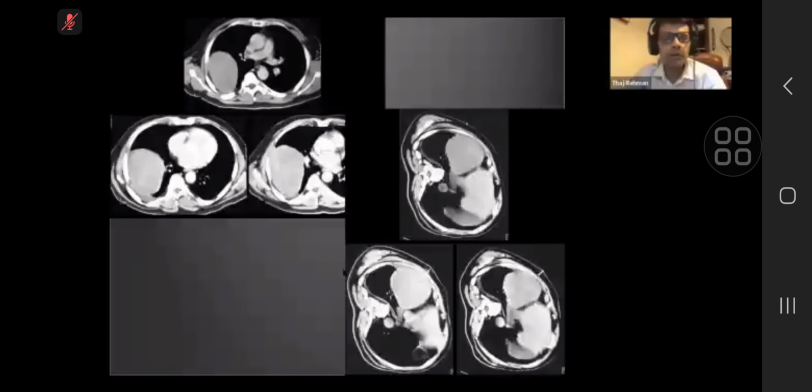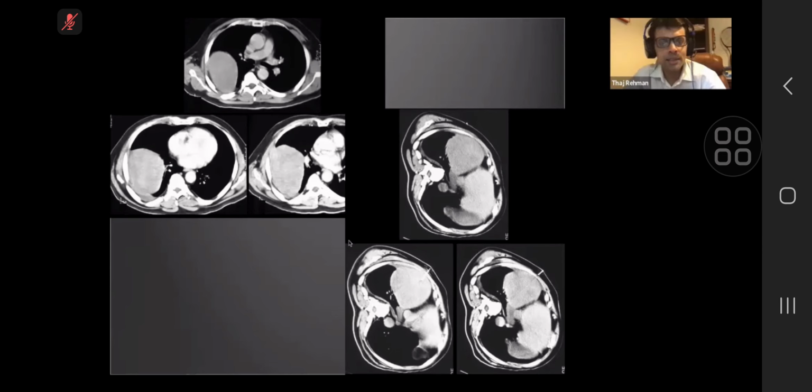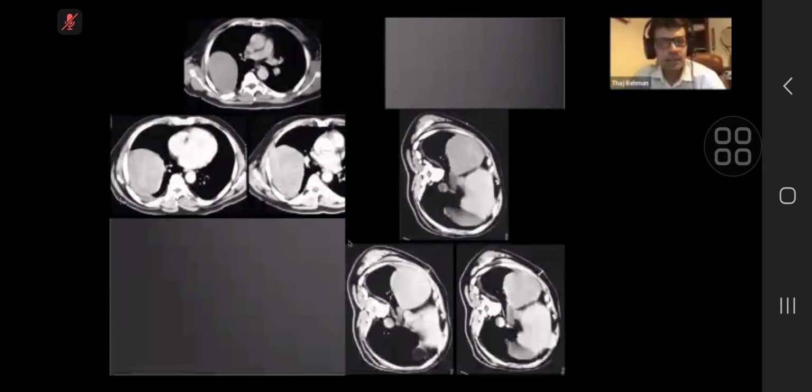Very good. So how did you reach that diagnosis? There is something that clinches the diagnosis here. Has this been biopsied? Well, I don't have the histology with me. From the CT pictures, there is something that can clinch the diagnosis. So it's quite well defined, shows uniform enhancement and makes an obtuse angle with the chest wall. That's all fine. There is one thing that clinches the diagnosis. Have you got that? What about the position of the mass in different patient positions?